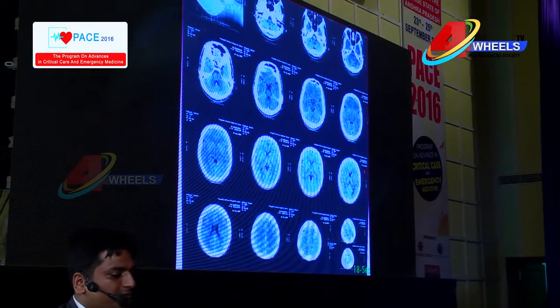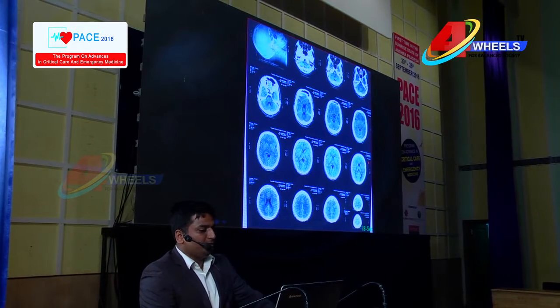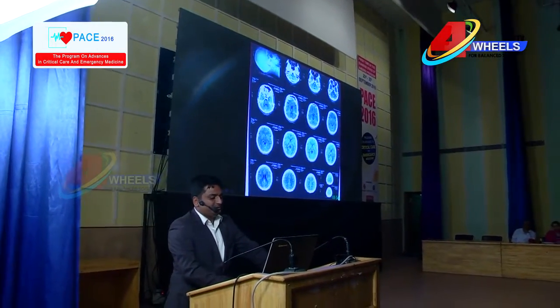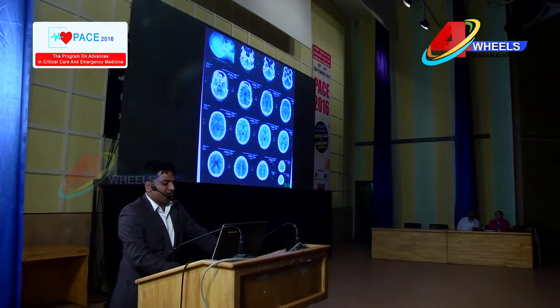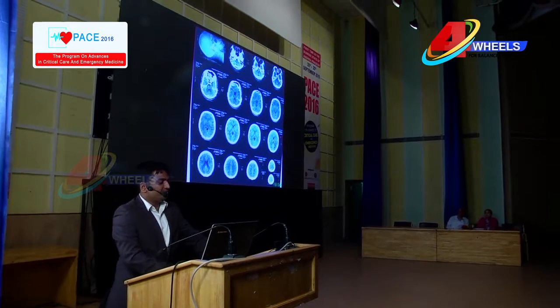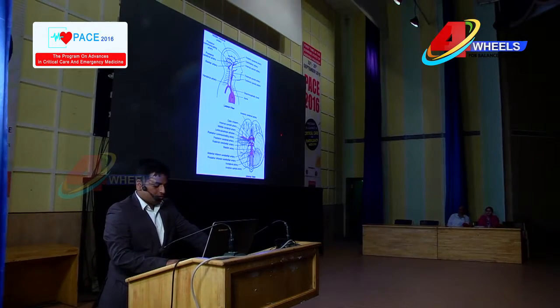Okay, all right. So we have seen these lines. These are all z-axis lines. Again, what is the first structure you will get? Medulla. What is this structure? Pons. What does it resemble? Tooth. Okay, what is this structure? Mickey Mouse. Mickey Mouse is the midbrain. So what is this blue-shaped cistern? It's the quadrigeminal cistern.